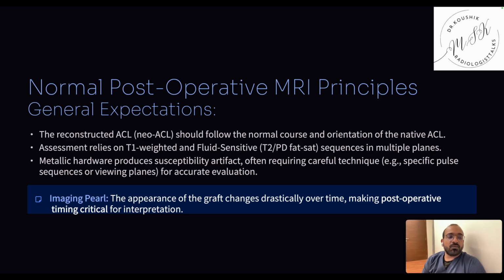Then what exactly are the normal MR principles? The reconstructed ACL should follow the normal course and orientation of the native ACL.